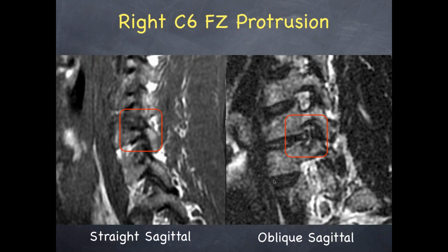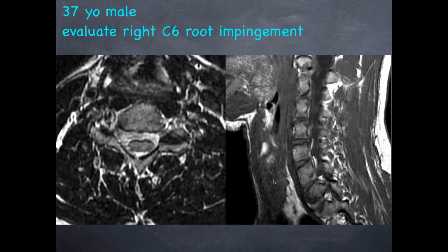Yeah. I don't understand why the cervical would not lend itself to a straight sagittal. If anything, you don't get coronal malalignment as much in the cervical as you do in the lumbar, because you're not cross-sectional here. You're going through it at an angle. And if you do the oblique sagittals, you're going through it like this. So you're partial voluming the bone. So if you go this way, in this part of the foramen right here, the slices are thick enough. Remember, these aren't real thin slices. This is MR. So in this slice, over here, you'll get part of the bone involved, and over here, you'll get part of the bone involved.